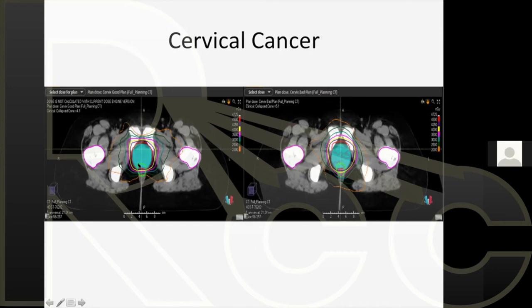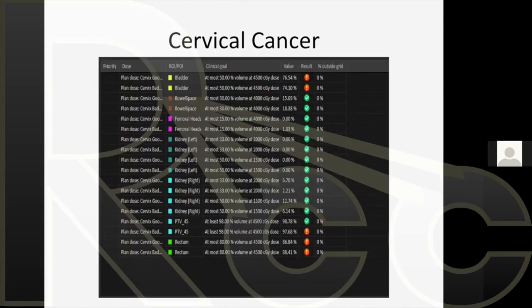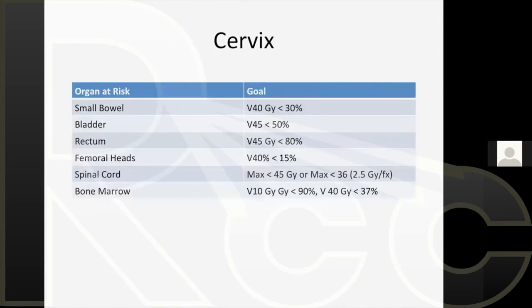So you have to look at a lot of different things and it just shows you the different doses and the different tissues, and you can decide which plan is better and which plan is not, but you've got to make sure you cover the area you want to cover. So this is what we give, and this is actually a post-op thing, but we do look at all of this. But I agree with what we heard from our earlier talk. You also have to look and make sure you're covering the disease, right?